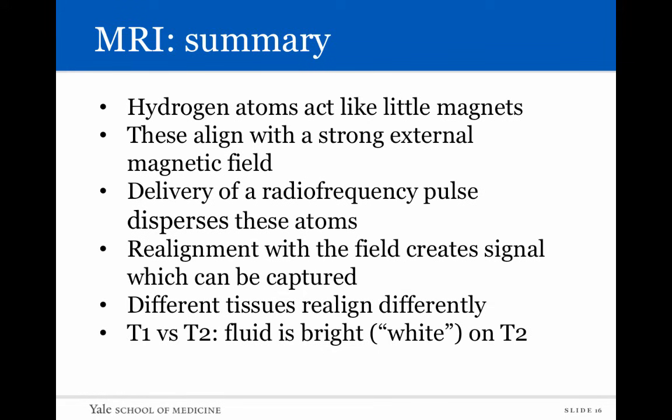Of course, different tissues that contain these hydrogen atoms will realign differently. Our basic sequences are T1 and T2 weighted, and a quick way to differentiate those two sequences is to look at the fluid. Fluid is bright or white in appearance on T2 weighted images.